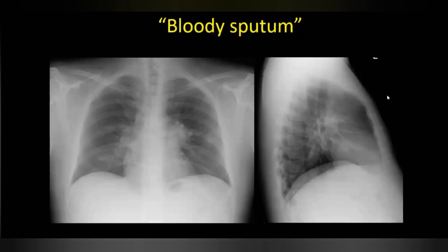However, the rest of the soft tissues appear unremarkable. No evidence of any lytic or sclerotic lesion in the bony skeleton. The visualized part of the upper abdomen reveals no abnormality. So keeping in view the left hilar enlargement and the soft tissue faint opacities in the right lung pericardiac region and left lung mid-zone, my differentials would be, first, an infective process like tuberculosis. My second differential would be some neoplastic lesion, a central obstructing mass with some deposits in the lung.